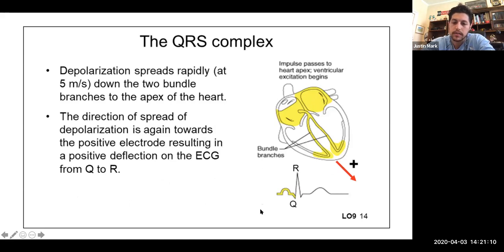So you guys know, as a whole, the QRS complex represents the depolarization of the ventricles, and again, in lead 2, it's going to be very, very positive for a couple of reasons. The vector's over here. You're going to hear me say that a lot. Also, the left ventricle is a lot thicker. There's a lot more muscle, so it's going to require a lot more signal to depolarize, and therefore we're going to see a very positive deflection.